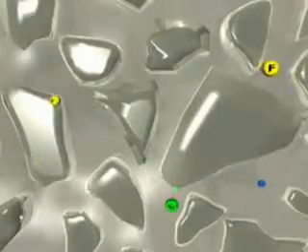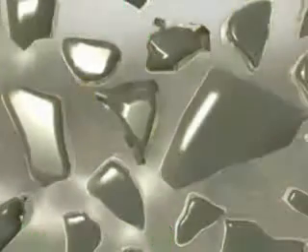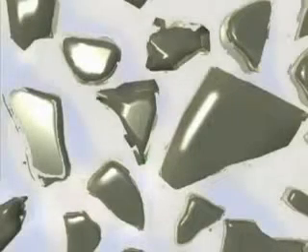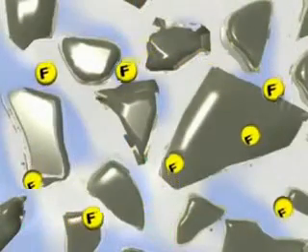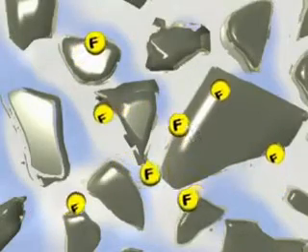During mixing, the glass ionomer liquid coats and reacts with the glass particles, releasing strontium and aluminum ions. These ions react with a polyacid to form a strong matrix which surrounds the glass particles. Water is an essential part of this reaction, and the final set cement contains approximately 20% water. Fluoride ions are also released during mixing. However, these form no part of the cement structure, and due to the remaining water in the glass ionomer cement, are mobile and free to move throughout the matrix.